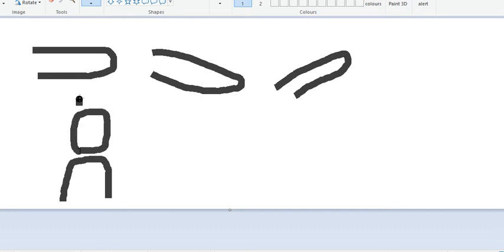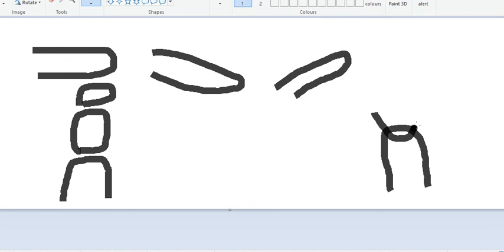This would be the phalanges in a good position, clearly seen through the joint space. With these kinds of positional errors, you're going to have a DP that looks a bit like this, and there's some overlap between the phalangeal bones.